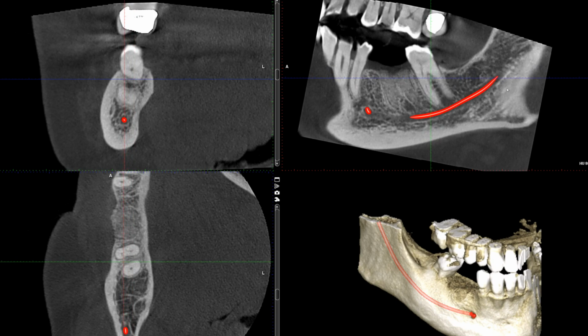On top of that, the mandibular canal itself is also well corticated. So this patient is nowhere near being diagnosed with osteopenia or osteoporosis, and we can just tell that from their overall bony architecture and density.